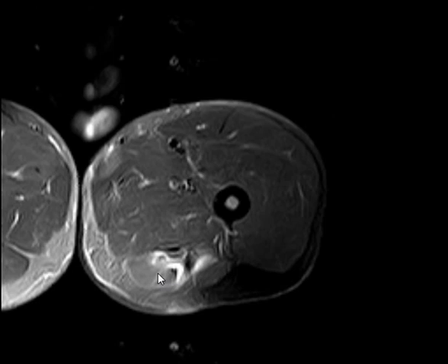Which is the most common site of what pathology? Tear. The most common site of a muscle tear or laceration or injury is at the musculo-tendinous junction. So now we are going in the direction of a partial tear, of course there is no muscle retraction. So there is a partial tear of the adductor longus at the site of the musculo-tendinous junction.